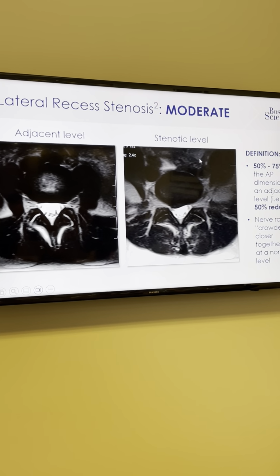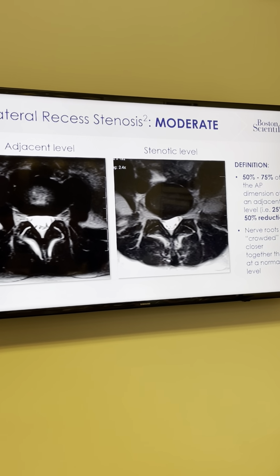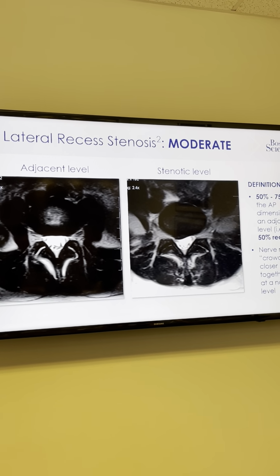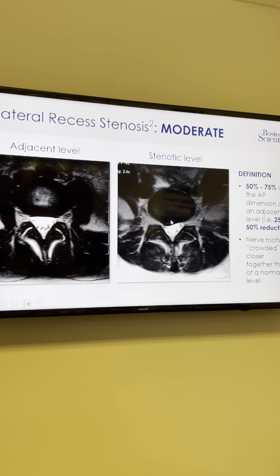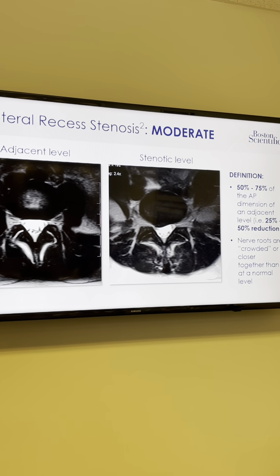It's been displaced. Yes, displaced, that's the right word. We've had a displacement of the right nerve root. Is it reasonable to say mass effect or no? Technically, sure, it's being displaced because of a mass. You could say there's a right paracentral disc herniation at L4-5 causing mass effect and displacement of the right descending L5 nerve root.